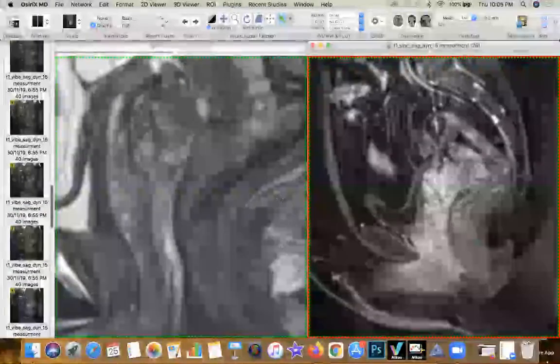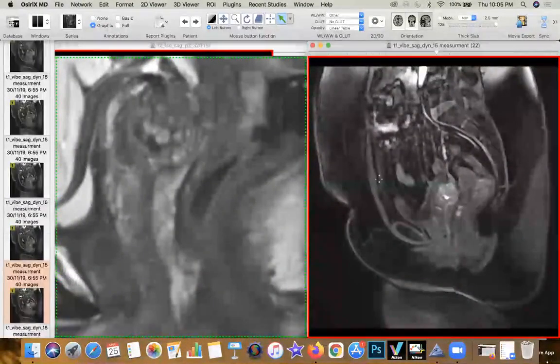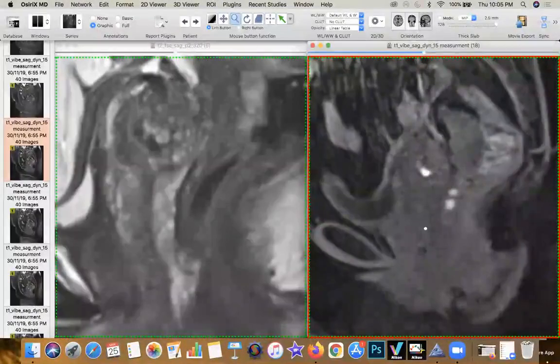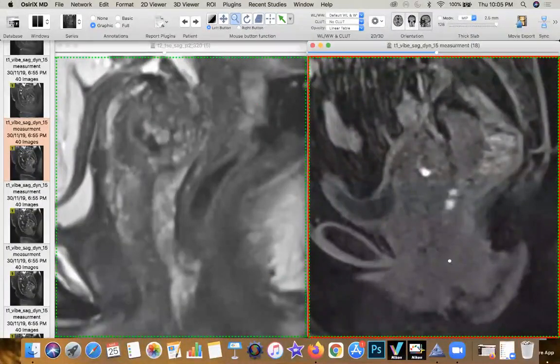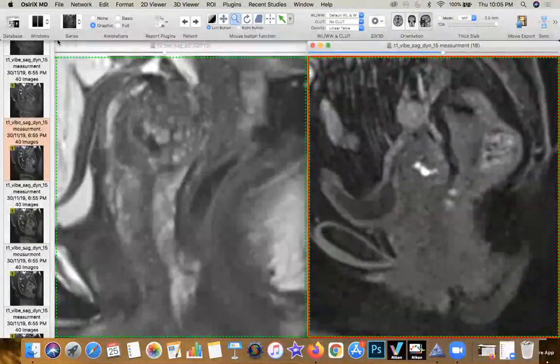Whenever you get vaginal vault or vaginal remnant involvement, it's pertinent to also assess where else that hemorrhagic deposit can be. So you can see this beautifully, how those hemorrhagic deposits are seen in this case just beneath the fibrous scar in the anterior rectal wall. But it's the duty of the radiologist to ensure that there's no disease which is skipped and has gone all the way into the vulva and therefore into the anterior and the posterior fourchettes. I won't be showing too much of that today because of the time limitation. But that's again a very common site where you can see vulval endometriosis secondary to the deep pelvic endometriosis invading the vagina. So that's an important structure to remember.